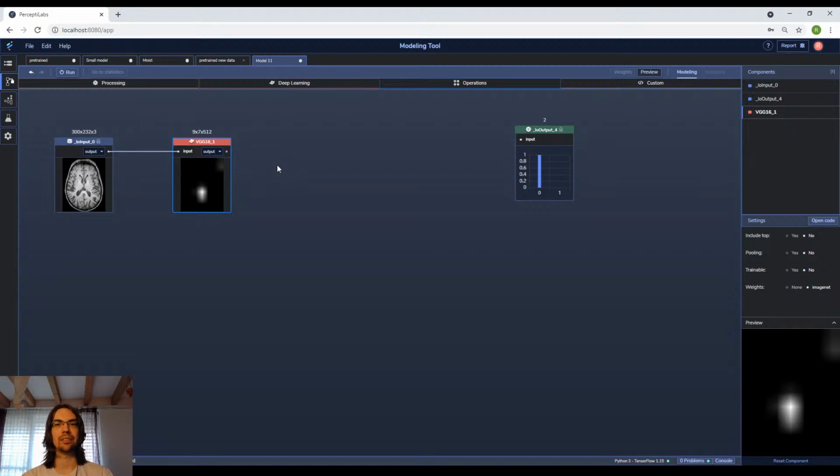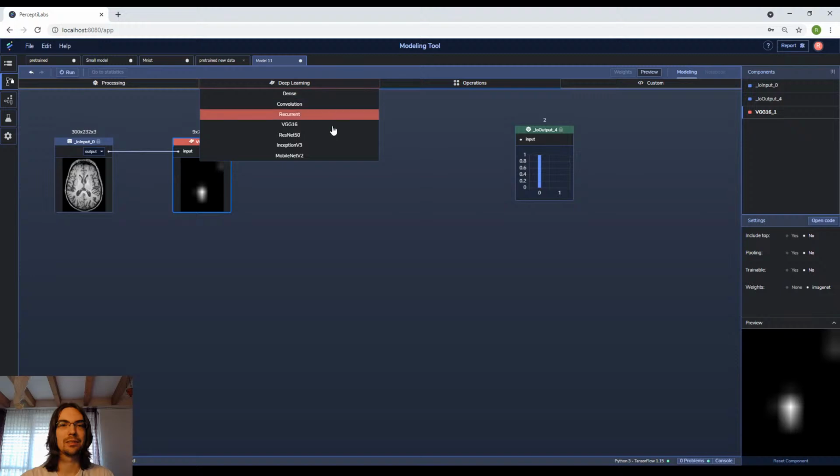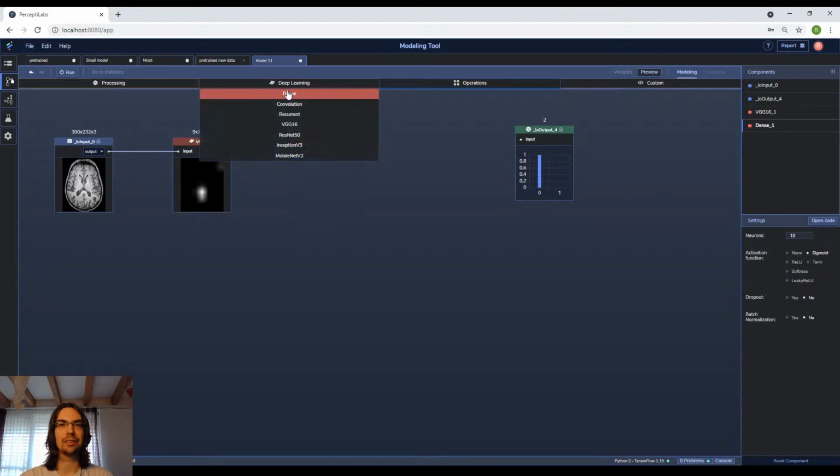The reason I'm using VGG, it's really high performant considering how relatively small it is, and it's pretty cool because it is just convolutional layers compared to some of these more complex models. So after we have our pre-trained model, this one, just like before, will not be trainable. So we're not going to train it, we're just going to use it to extract features from the images. And the trainable part of our model will instead be these 2 dense layers.